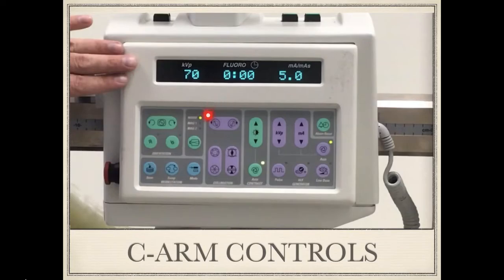Moving on to the next section, which is this one. This is all to do with collimation. There are two types of collimation. Collimation basically means reducing the area which you are seeing, and this can be quite handy. I use it regularly to reduce the radiation exposure and make my images better. It is handy when, let's say, you're seeing the sacrum in a lateral image, and because of the density of the hip joint below and a different density of the air above the sacroiliac joint, the image quality is quite variable, and often you struggle to see the images. So that is one situation where I use collimation very regularly.